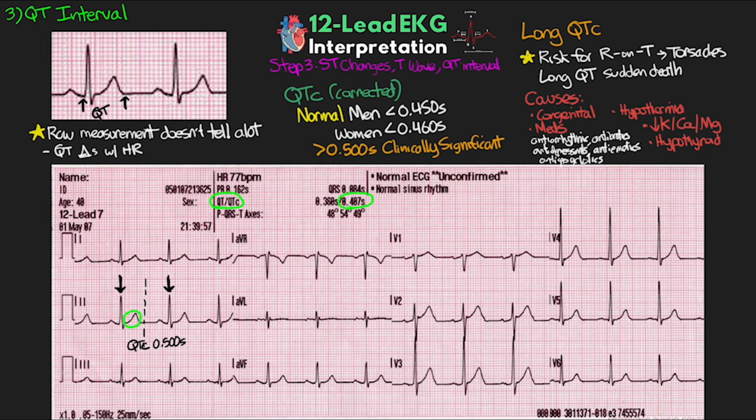All right, so having done that, we have gone through all the different steps and looked at all the different parts of the EKG. Now, obviously, we went through some of this stuff real quickly here. Like I said, on a lot of this stuff, I'm going to have individual lessons where we can break this down in more detail.